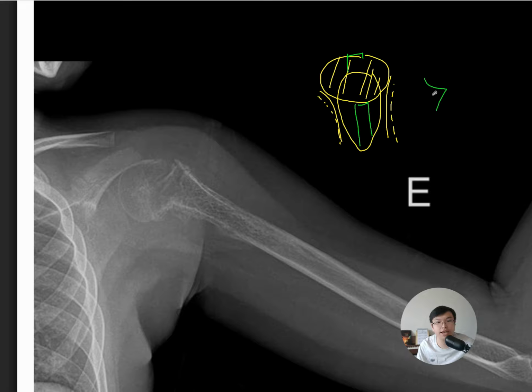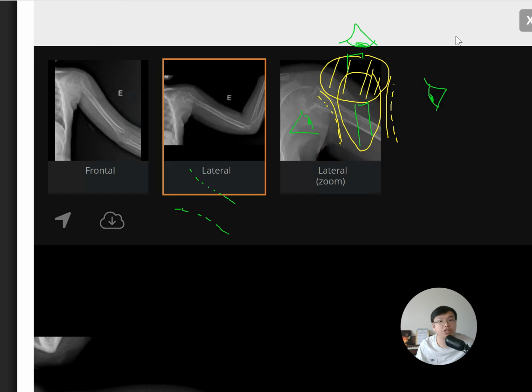So we need to have another view so that these two portions will become in profile, just like here. For example, you see better laminated periosteal reaction in this view. Okay, so we are actually visualizing the circumference of the bone in different angles, at least in two planes, orthogonal in nature. Okay.